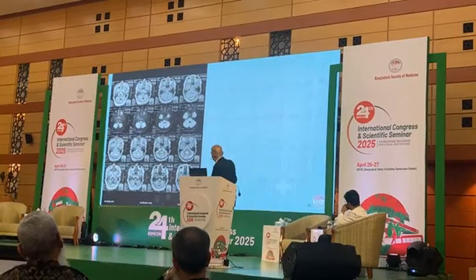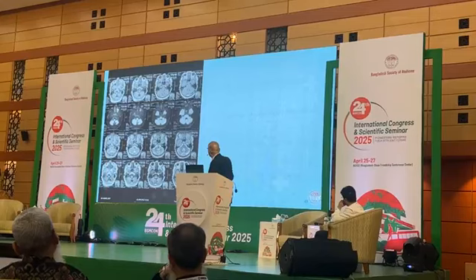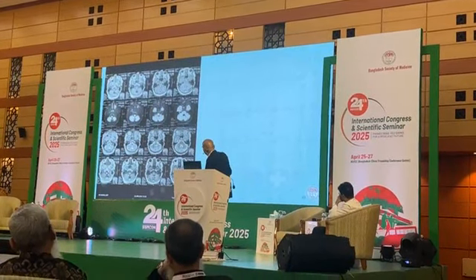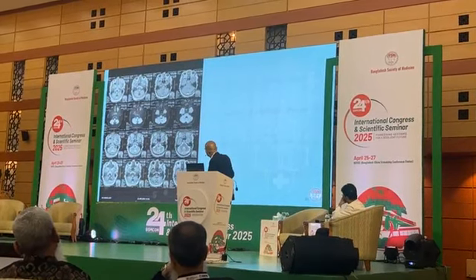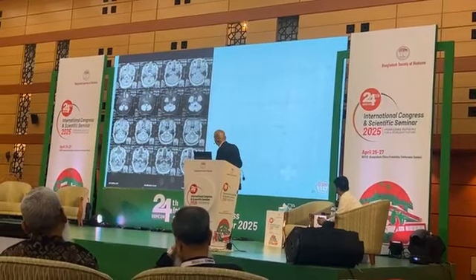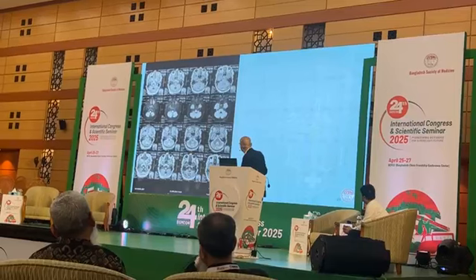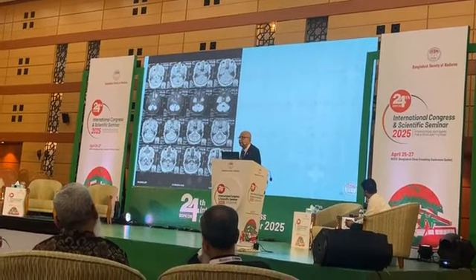This is T1, this is T2, this is DWI, and this is FLAIR. And can we see the medulla oblongata? We can see a white lesion in the right medulla oblongata, here, here, much better, here. I'm not sure. Can you see that? This is small. Yes. Can you all see this?